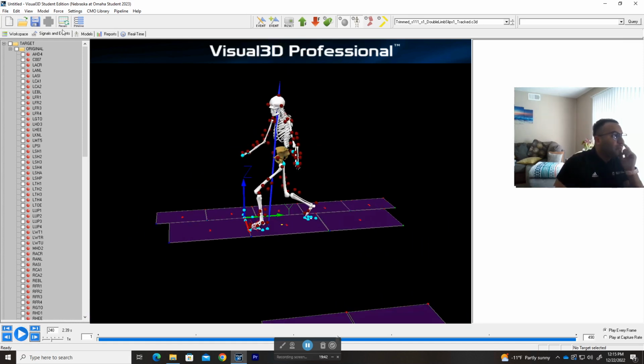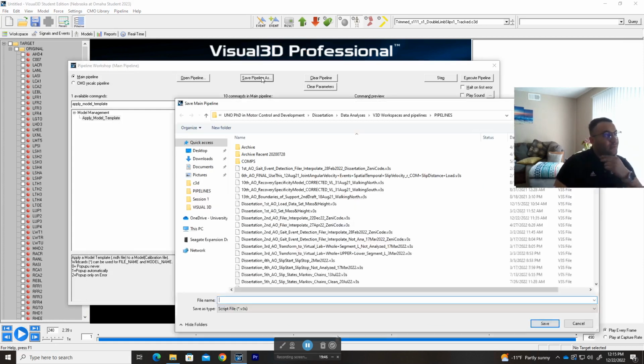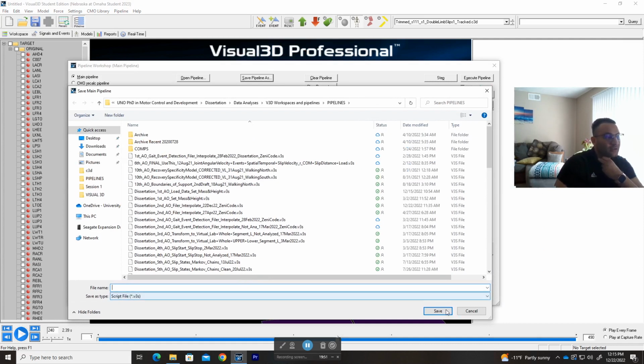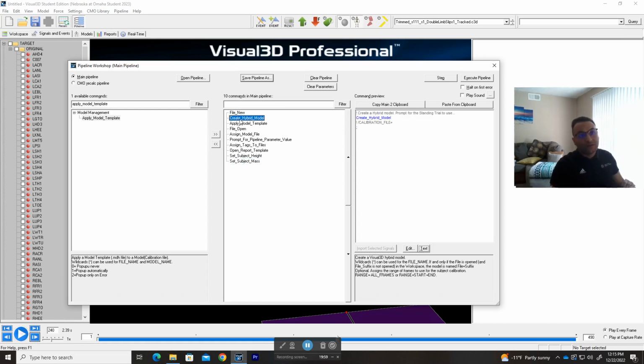Alright, so now the next thing you need to do is go to the pipeline, and if you need to save it, you just save pipeline as, I already saved it, and then choose any place you want, and then click save, and you choose the name as well. Alright, so this is just the complete basics.